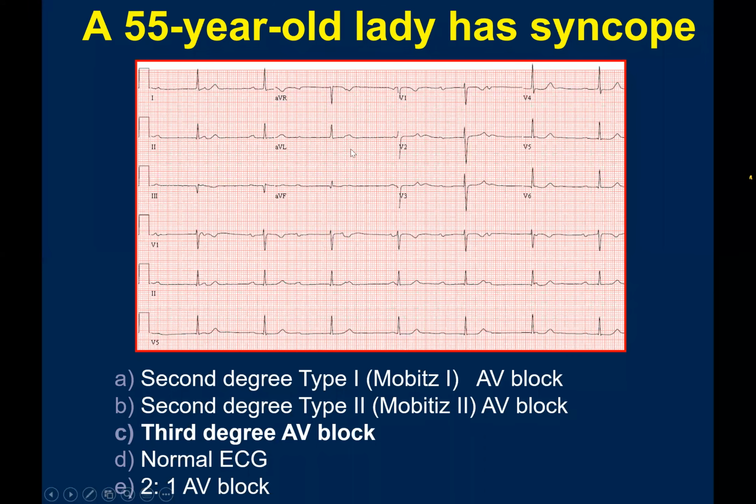One thing I did not mention earlier, but as I'm sure you are familiar, the layout here is the limb leads and chest leads, and you have 3 rhythm strips there. For regularity and rhythm, we use these 3 rhythm strips. If you follow, for example, lead 2 here, we see a hump there, and there is no P wave for this complex. There is a P wave there, and another P wave here at the end of it.